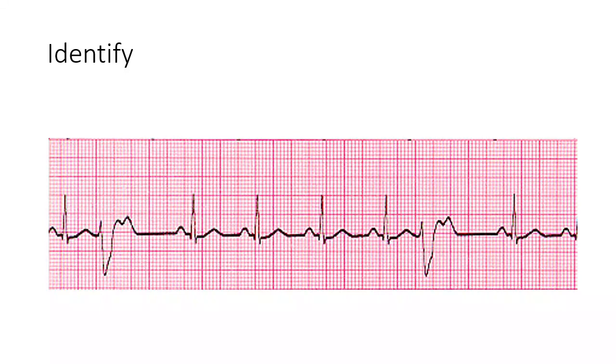I'm going to say, well, let me go through it first. There are P waves with the normal looking complexes, and the funky looking complexes. Okay, so I'm just going to stop saying normal. I'm going to say normal sinus rhythm with idioventricular escape beats. I just get confused on which one has idioventricular. Ventricular escape beats. No. Go ahead.